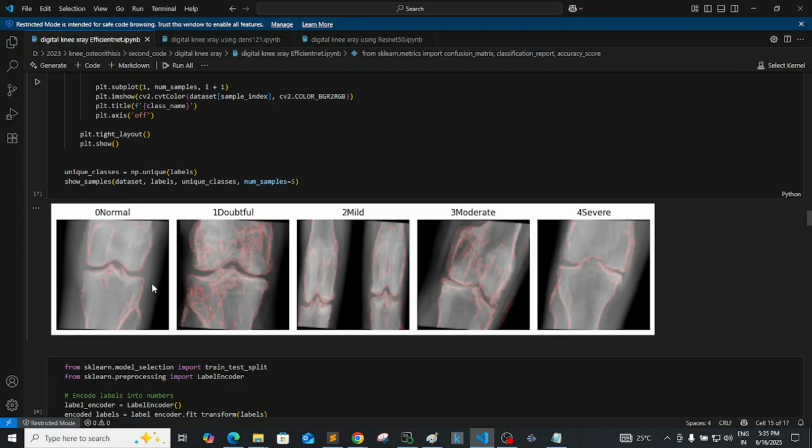We did such an edge detection technique that this blur doesn't matter. The background is suppressed and should not affect our result, so only the bone structure is taken into consideration. This is a way of highlighting the region of interest using multiple pre-processing techniques.